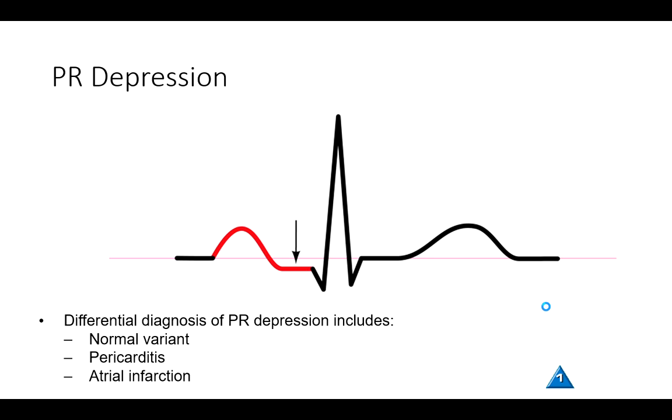It could also be that the pericardium, the fibrous sac that encircles the heart, is inflamed: pericarditis. Is the patient presenting with chest pain? Have they had any condition change in the last couple weeks, days, months? Typically, if we do have pericarditis, the depression that we see is a lot of times going to be diffuse, changing in most all leads.